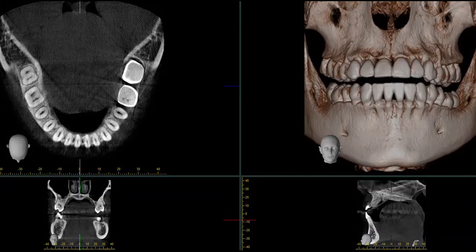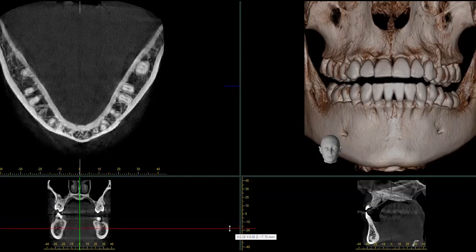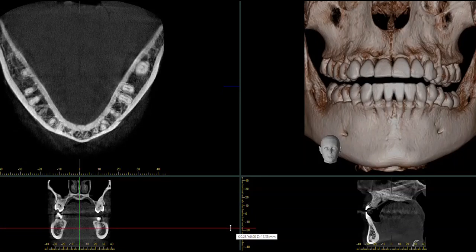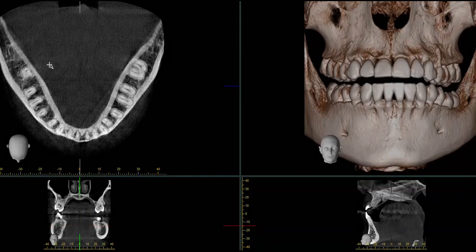The apex of the first molar is typically located between the buccal and lingual plate, while the apex of the second molar is located much closer to the lingual plate. Therefore, buccal anesthesia is of no benefit pulpally for lower second molars.